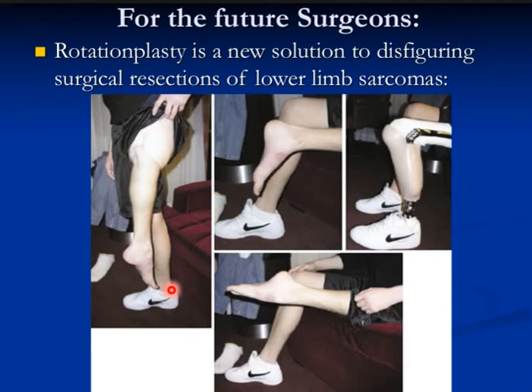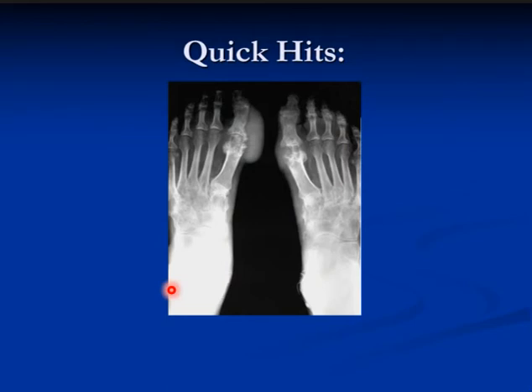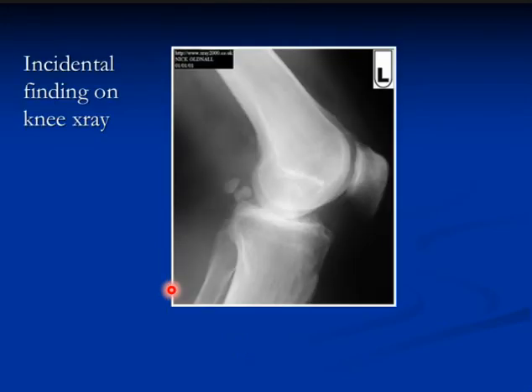So, let's go with some quick hits, some short cases. Diagnosis? Gout, excellent. This is gout. Let's go for an incidental finding on a knee X-ray.